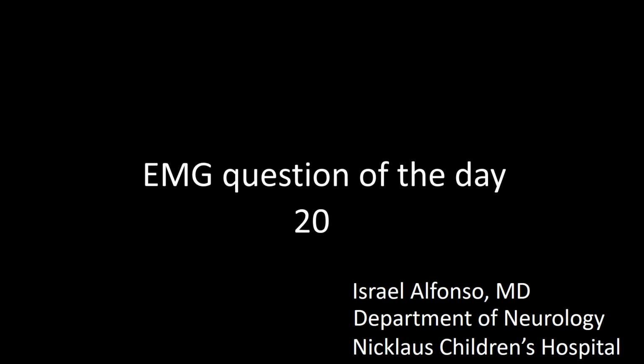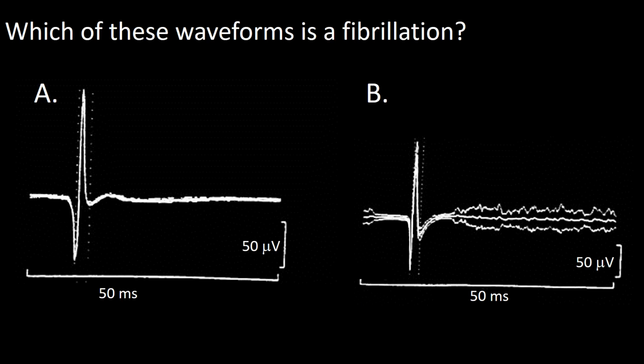EMG question of the day. Which of these waveforms is a fibrillation? Please take a look at these figures and choose A or B.